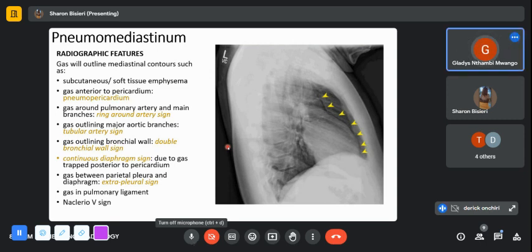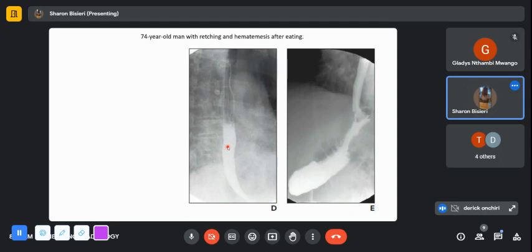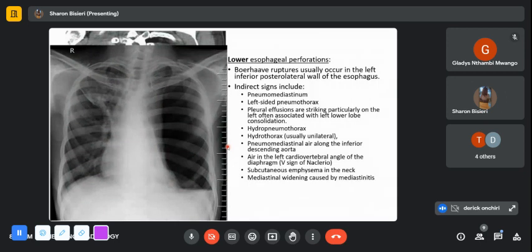Any other question? Yeah. There was a previous image I wanted to ask about. Maybe Doc, if I take you back just a minute. I'll scroll backwards. That one, this one. There's a chest X-ray, just until this one. You had said which view was this? Because I had AP. Yes, AP. Okay. So for me, I was thinking it was a PA.